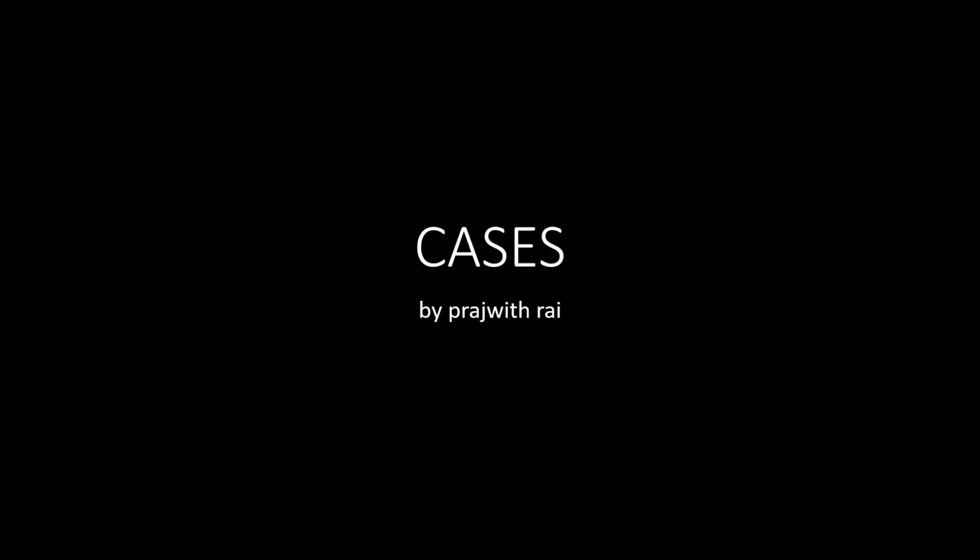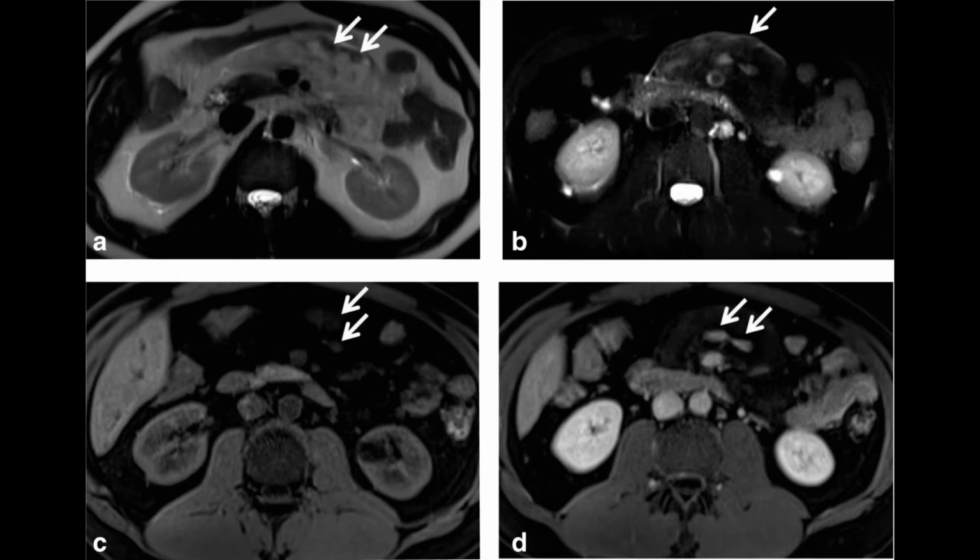Now, if you see a few cases, this is the first case. What we can see here is a T2 weighted image. We can see there are two T2 hypointense areas which are appearing hyper on a fat suppressed T2 weighted image. So what it tells us is that this is not a fat containing lesion, because it is bright on the fat suppressed image. Also, if you see the surrounding of that, there is an area of mesentery where the mesentery is supposed to be present.